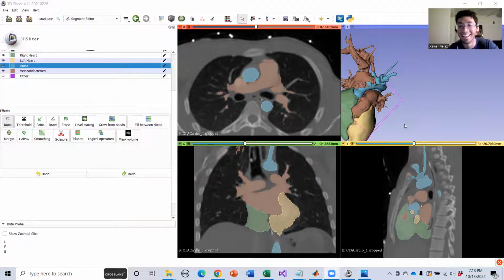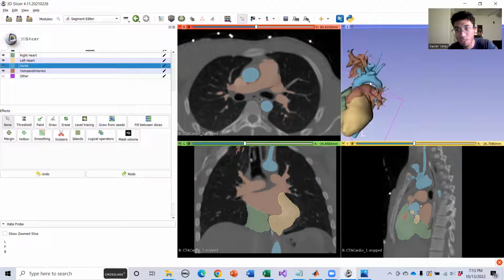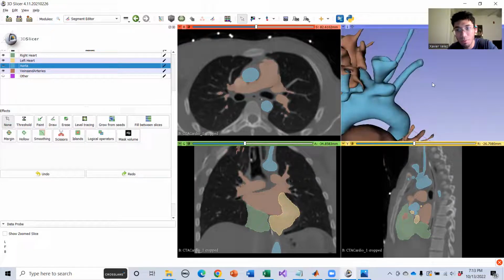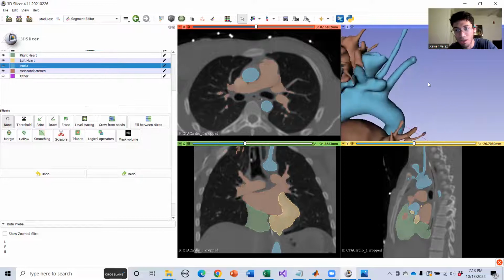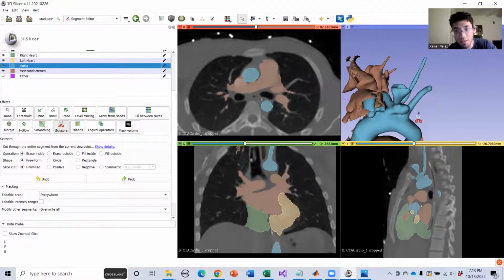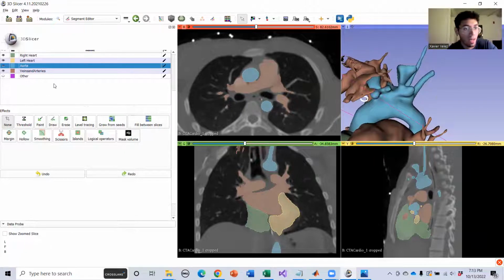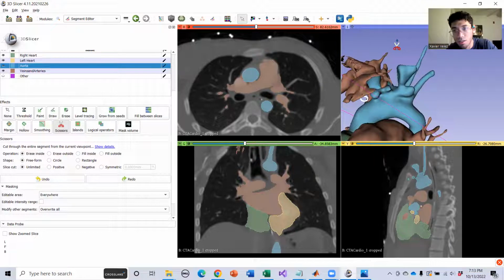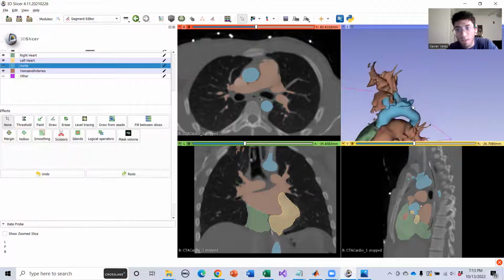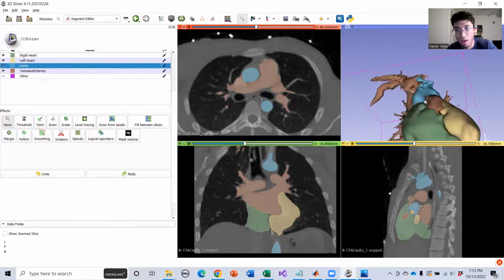All right. Okay, so let's cut out a few other things that I think are making this look particularly noisy. I'm going to cut out a little bit more from this aorta. There's just so much here, and really we only care about this main branch, right? So I'm going to take this, maybe angle it a little like that. Yeah. Okay. I'm just going to get rid of all of those guys. It's little spiky hair, right? So now we have that, and I'll keep him buzzed. He can keep whatever he's got going on there.